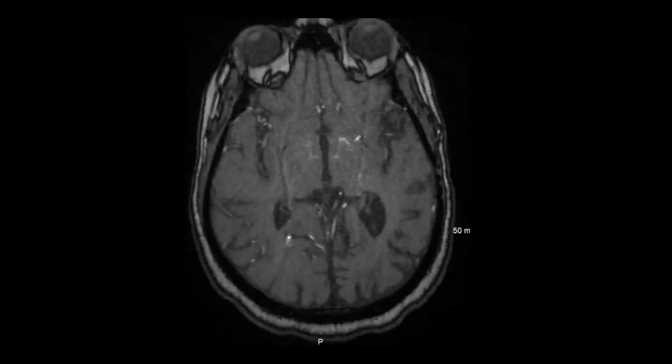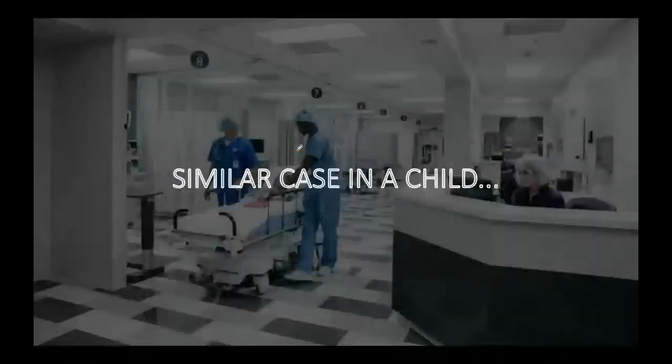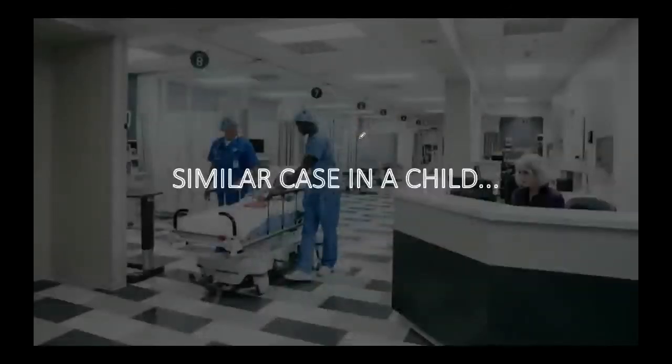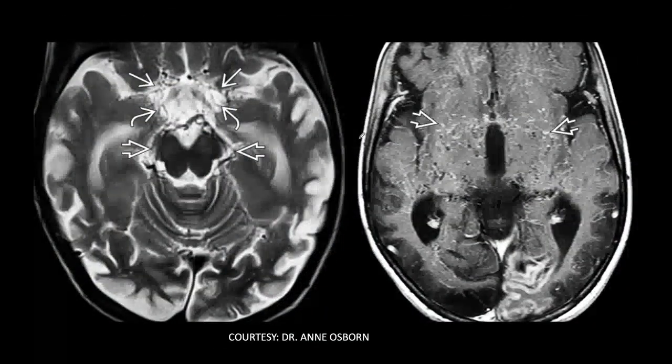And when you look at the image itself, you can see some of these prominent increased signals, which would be the collaterals of the lenticulostriate arteries. And then you see the significant narrowing. I'm going to show you another case in a child where it's really well seen.